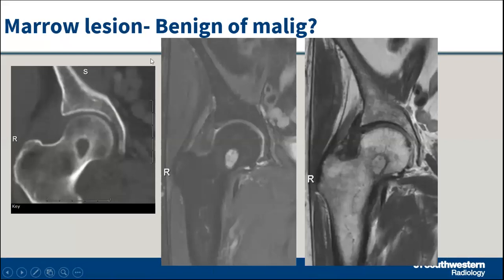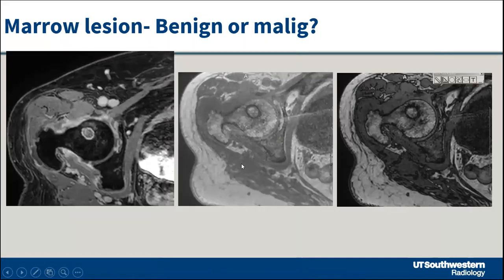Now, you can get confusion with these kinds of tumors. So here is a tumor with a nice rim of sclerosis, right? I sent it to OCAD some time ago, but basically it looks like an enchondroma, doesn't it? It's bright on T2 images, maybe tiny punctate calcifications, which we don't see on CT, but maybe something there. On contrast, there is enhancement of the lesion, some at the periphery, some inside, just like you see with enchondromas, not a real fibrocystic change, not near the bone. And then if you look at in and out of phase, it suppresses out a tiny bit.